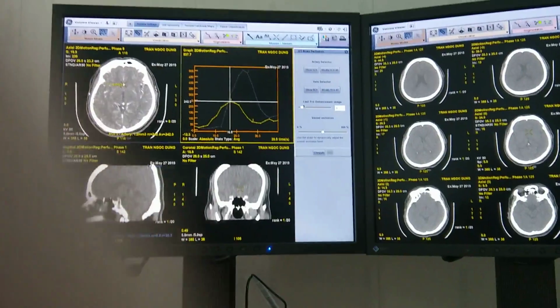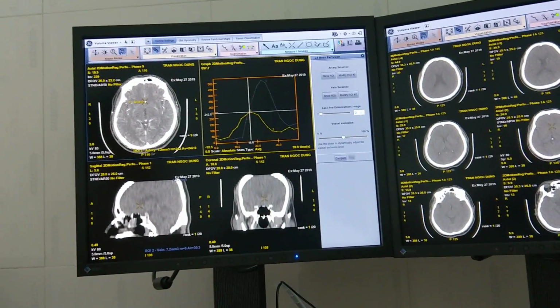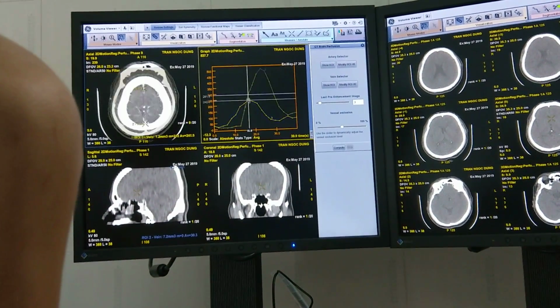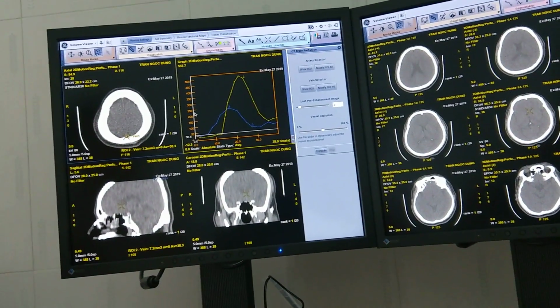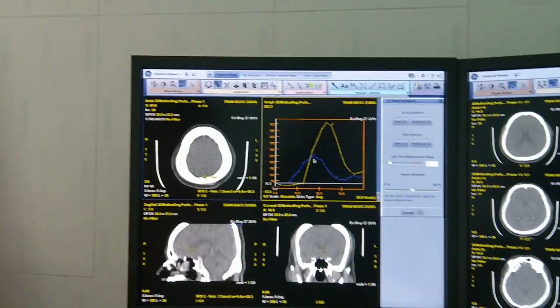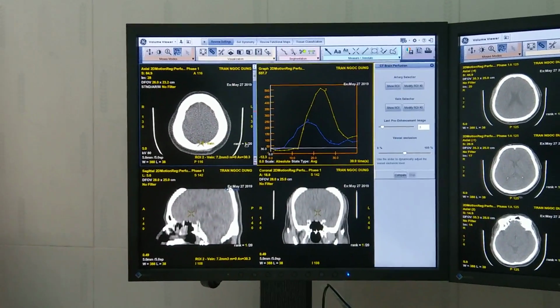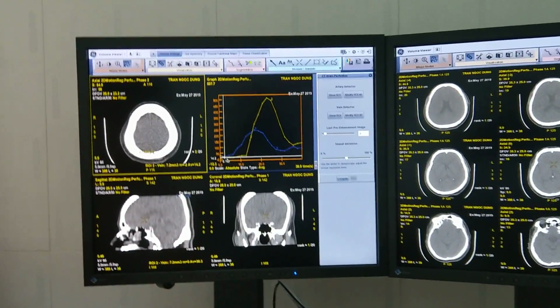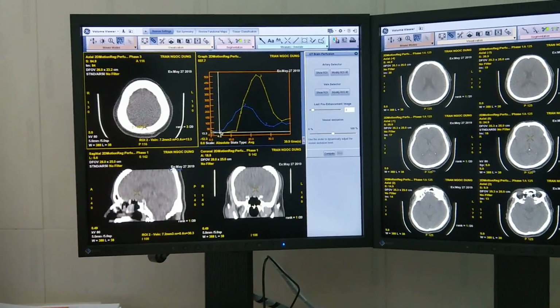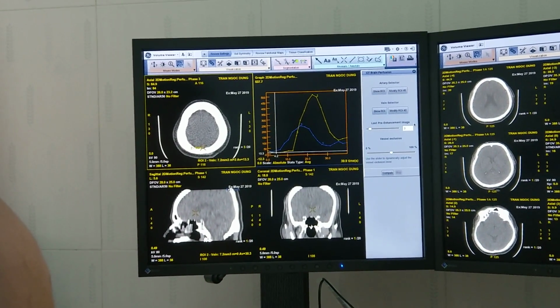Okay. Then the last pre-enhancement image, usually the computer will also do auto 3. So the 3 is when the first image come out, the first image enhanced. So that is the number 3. So this is number 1, baseline. Number 2. So number 3 is start go up. This is where we start our last pre-enhancement image.